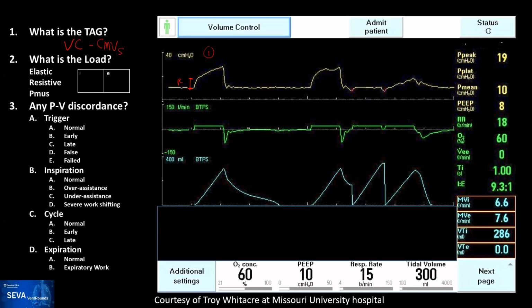And so we can barely see if there is. So I would suspect that there is increased resistance for this, but that would be one of the hints. So remember, if you have one of these, it can help you. So I would say resistance is possible.